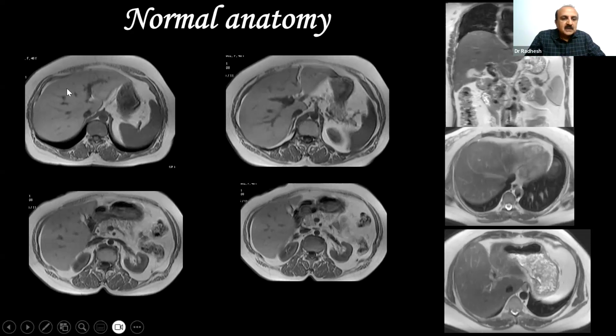Now, so this is liver, and now let's look at the other structures which are close to it. What is this area? Now, black. What are the things which are black on T1 or T2? It is either cortical bone, flowing blood, or air. Now, why is air black?